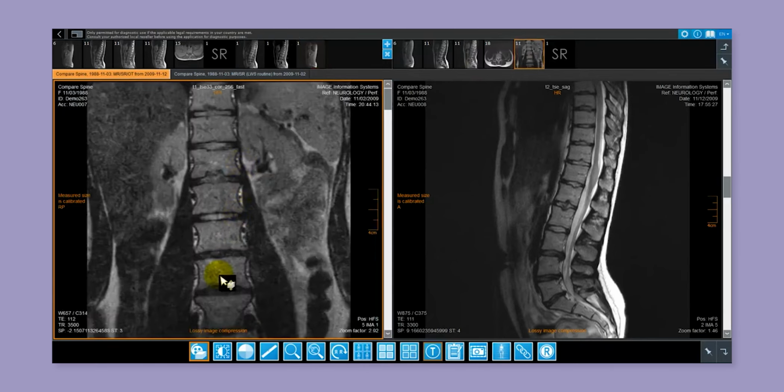Below the viewer lie many tools such as Cine Mode, Center Window, Measurements, and so on. Clicking on these tools with the left mouse button selects them, while clicking with the right mouse button allows you to configure them. If you're using a touchpad or similar input, a short tap is equivalent to a left mouse button click, while holding for a couple seconds registers as a right mouse button click.